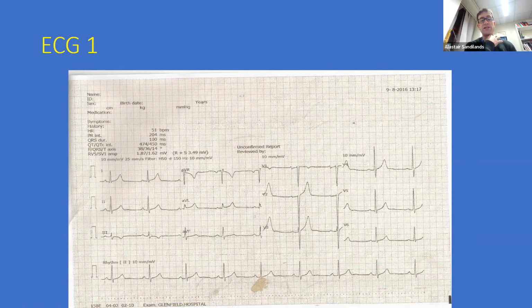What's the character? Is this a chest pain that's suggestive of ischemia or even pericarditis? So you're going to make sure you do that, repeat the ECG to see if there are any ongoing changes, and certainly do a troponin. But hopefully this signifies to you that T-wave inversion in lead 3, aVR and V1 is normal.